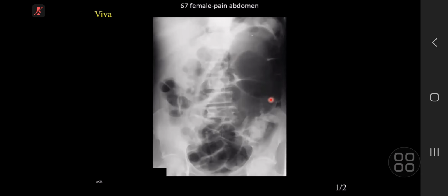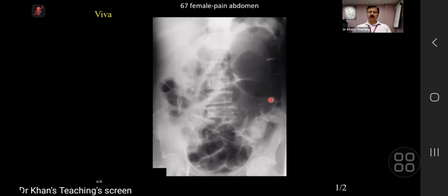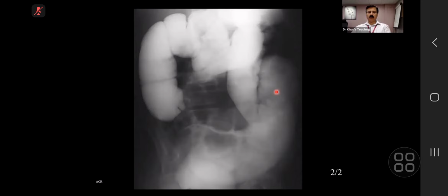The patients who have got a redundant cecal mesentery, that will twist. So sometimes the cecal volvulus will sit in the left upper quadrant like this. That's a take home. But the main point for you to remember is this haustral margin. On a contrast examination, contrast comes here, and if you look carefully at this loop, there is no contrast.